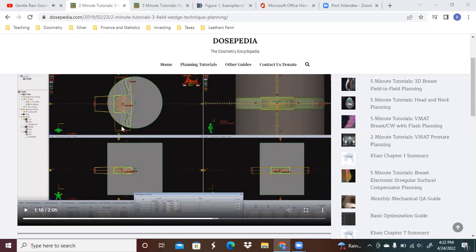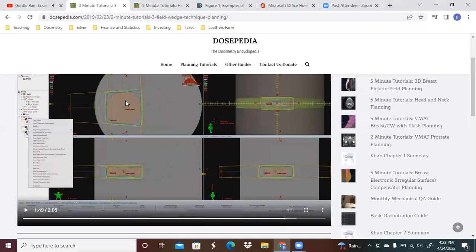And that usually comes about whenever you've got too strong of a wedge, both here and here, that is pushing the dose well over to the side. The higher isodose lines are going to shift from the heel to the toe, and that's why the wedge is there. In this particular case, you want to change the weighting, which is what this window is all about, such that you can go from a distribution like that to something more like this, and hopefully even something a little bit better, depending on how you adjust the degree of the wedges. Maybe you want to back off a little bit.